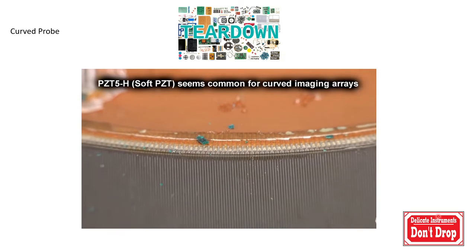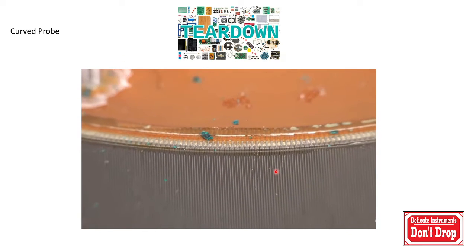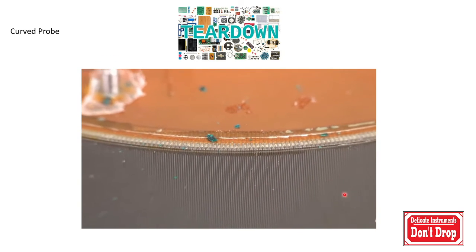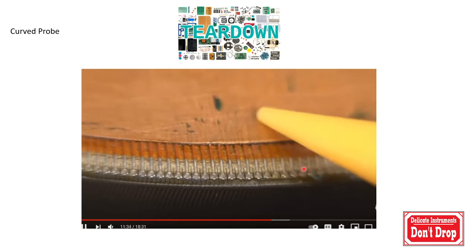So this is very delicate. When you drop it, this face is very much exposed. If it falls on the ground and hits this part, these piezoelectric crystals will be damaged, and you will end up damaging your probe. And be careful, mind you, the probes are very costly. So be careful when handling probes and do not drop them.